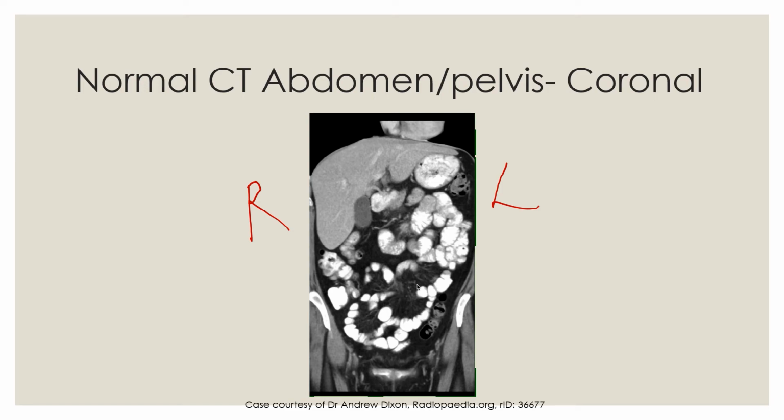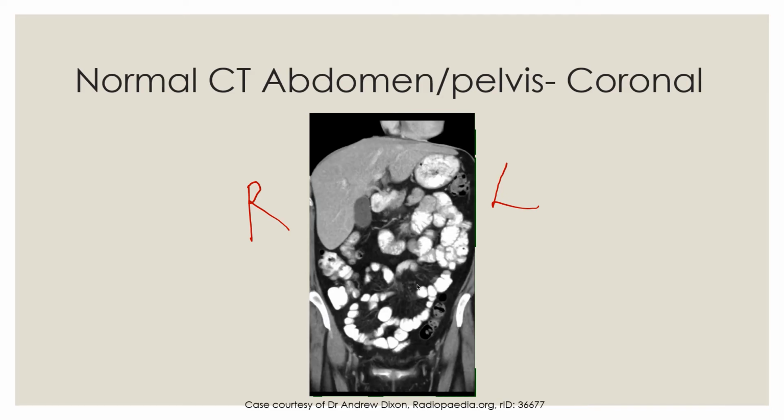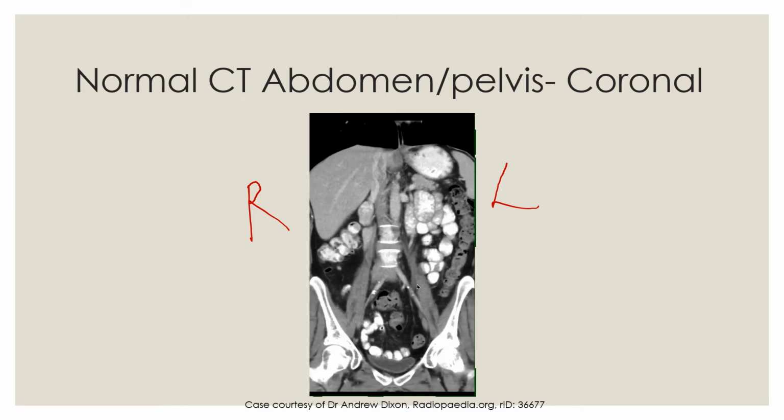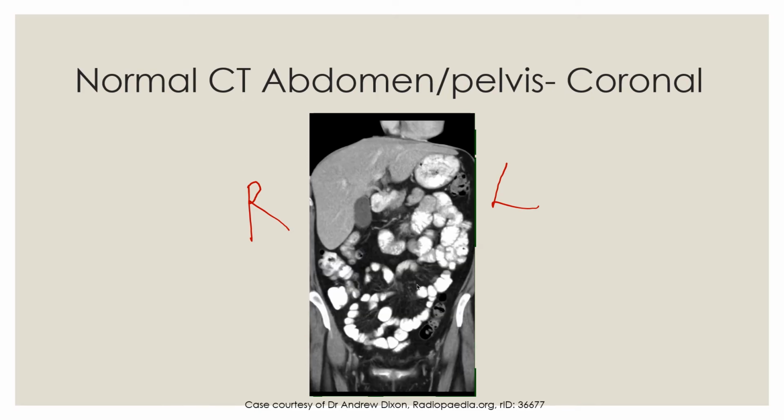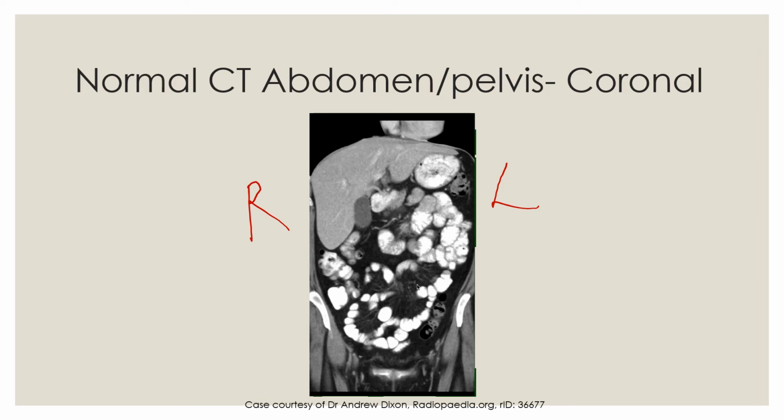And you can see this fluid-filled structure is our gallbladder. And I'm going to show you the stomach. So this is the fundus of the stomach. Body, and then we have the antrum here. So I'm just going to scroll through the stomach so that you can just appreciate it a bit better. Just going to scroll back and forth over the stomach.